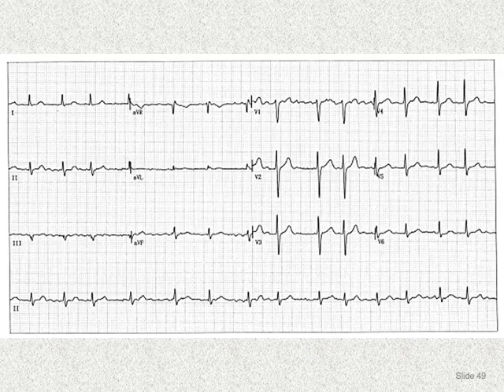This is the RR interval, and this is less than half. And if you calculate it even here, from here to here, almost 0.4. So this is a normal QT interval. So our report is atrial fibrillation at a rate of 90 beats per minute. This is easy.